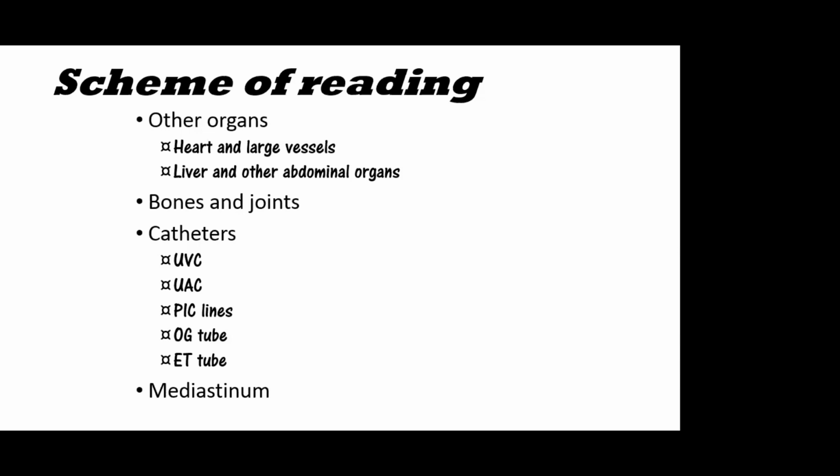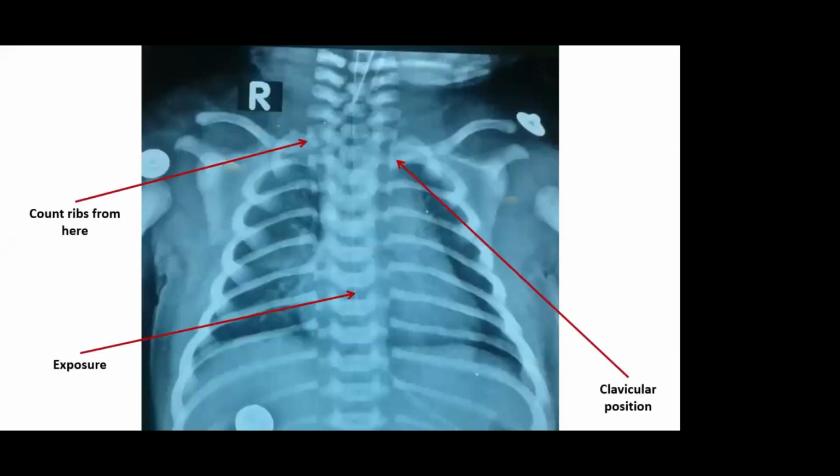In the mediastinum, you should be able to differentiate between a pneumomediastinum, where the thymus is being pushed up, and a thymus that is visible just because of rotation. If you see a thymus which is just like a sail and the surrounding lung parenchyma looks normal, it is a sail sign. But a pneumomediastinum will outline the thymus, so you will see a dark black line surrounding the thymus. That is nothing but a pneumomediastinum creating an impression of a sail sign. This is how you differentiate a normal sail from a pneumomediastinum making the thymus more visible.